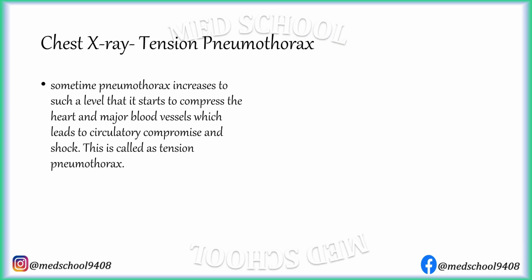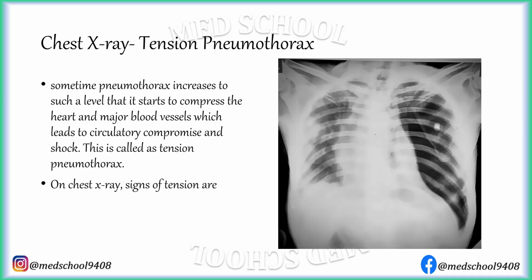Sometimes, pneumothorax increases to such a level that it starts to compress the heart and major blood vessels, which leads to circulatory compromise and shock. This is called tension pneumothorax. On chest X-ray, signs of tension are mediastinal shift and flattening of the dome of the diaphragm.